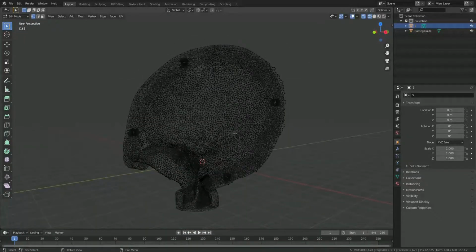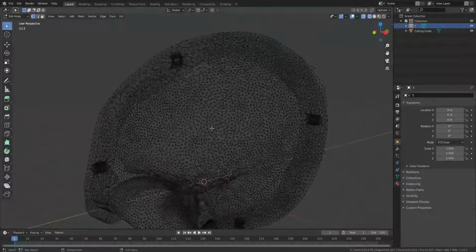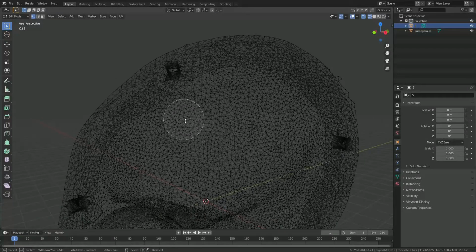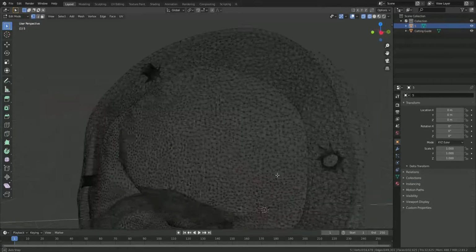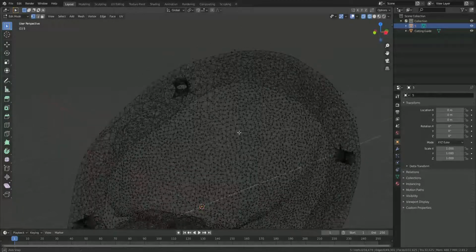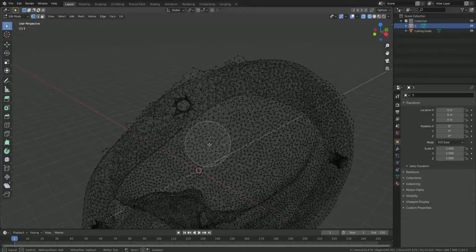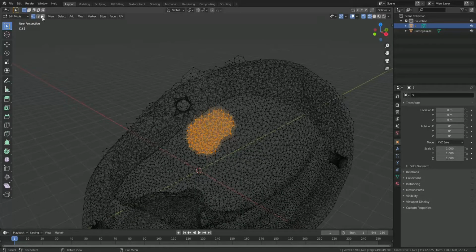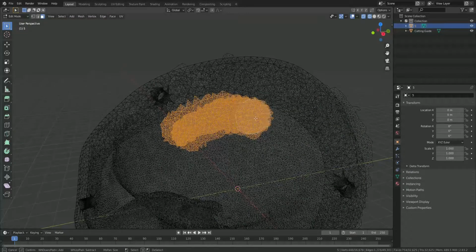And again, now you select the parts that you want to keep. It is hard to see, but this is the inner side of the cutting guide. Try to be as perpendicular as you can. Yeah, maybe this is easier for me to see.